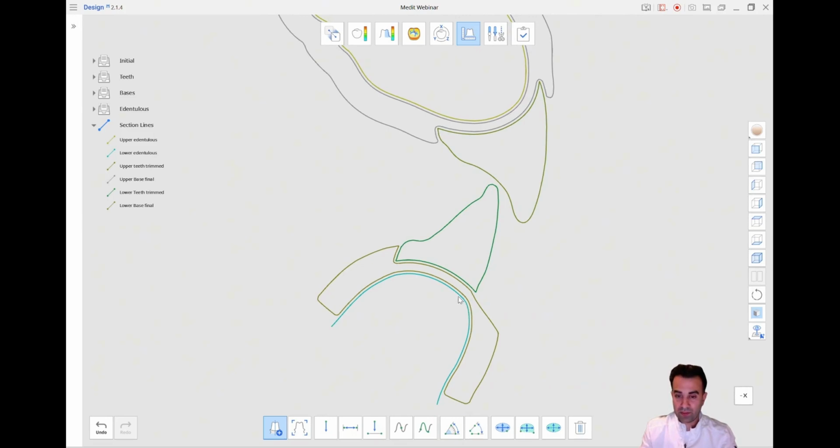That's the power of digital dentistry. That's the ridge, the space, which is the relief space, 1 millimeter of denture base, space for the bonding agent, lower denture tooth, an overjet, an overbite, upper denture tooth, the same space, 0.2 millimeters, 1 millimeter denture base, 0.2 millimeter relief in the dentulous ridge.